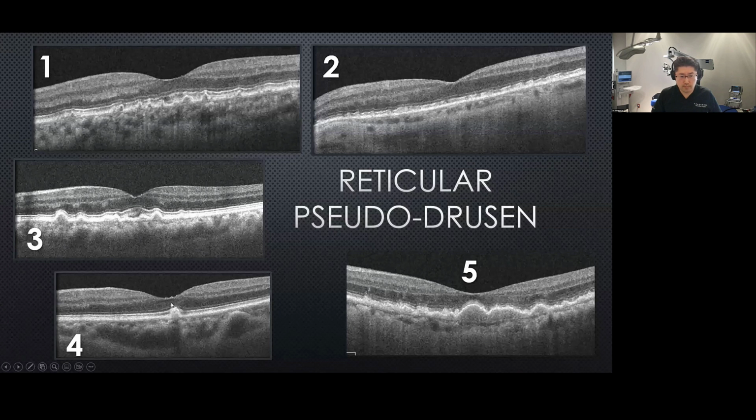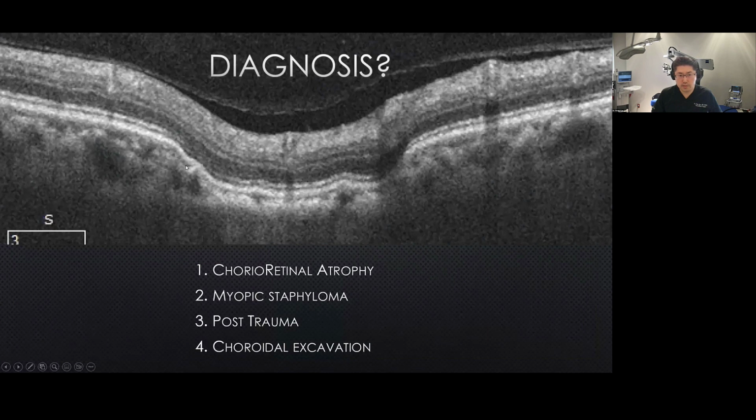4 is your pachydrusen, associated with pachychoroid, and usually these are isolated drusen. And 5 is your confluent soft drusen. And this, of course, with outpouching of the RPE, is choroidal excavation, which is associated with choroidal neovascularization and CSR.